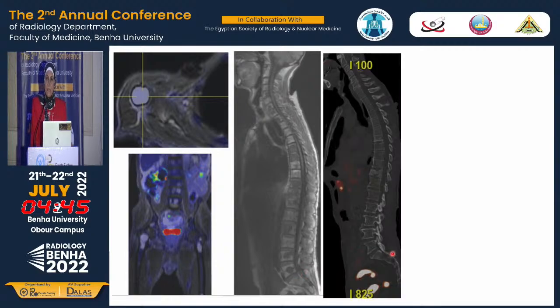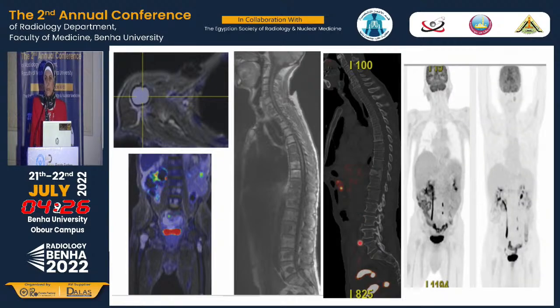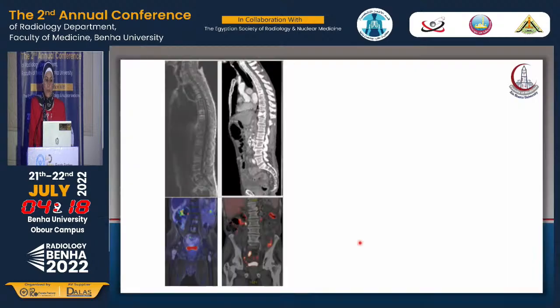Let's see the PET-CT, which was performed just prior to the MRI, and this was completely negative on the CT with no apparent lytic or sclerotic lesions noted, because these lesions were truly marrow lesions and they are completely negative on the PET and on the CT images. And of course, both studies are negative for the PET component, so MRI is more valuable in evaluation of local and distant metastatic deposits for this patient.